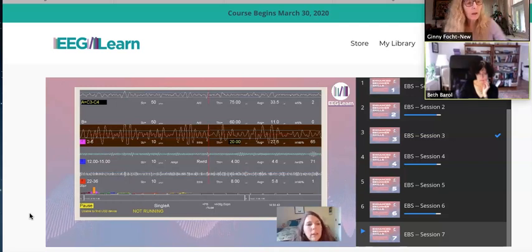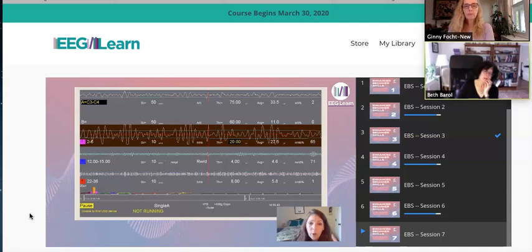So the 12 to 15 hertz activity, betas are easy because they're always 5 or 6, whether you're talking about a monopolar placement or a bipolar interhemispheric placement, it's still the same. You only need 5 or 6 microvolts there. So the 12 to 15 isn't that far off what it should be. The 22 to 36 also isn't that far off from what it should be. It should be 5 or 6, it's 5.8. So the thing that is way off what we would expect is this slow wave activity, or the difference in what's happening in the slow wave activity left versus right. So that's going to be the target of my training.